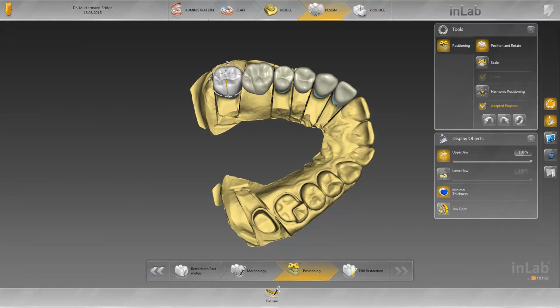When using a given tool on a unit, the tool stays active when moving to another unit on the restoration. To change to Scale, hit the space bar or click on the option Scale. To retract changes, click on Undo. If one wants to use a tool simultaneously on multiple units, it is possible to group the units.